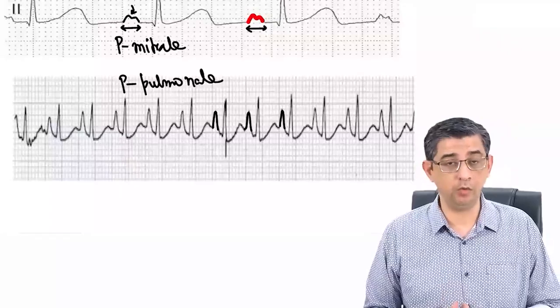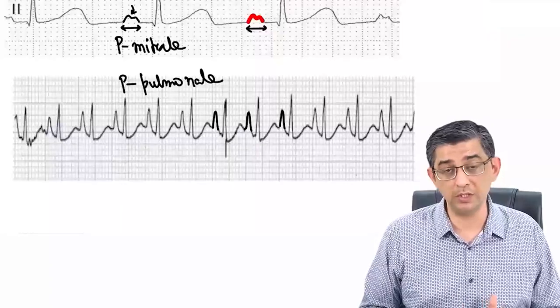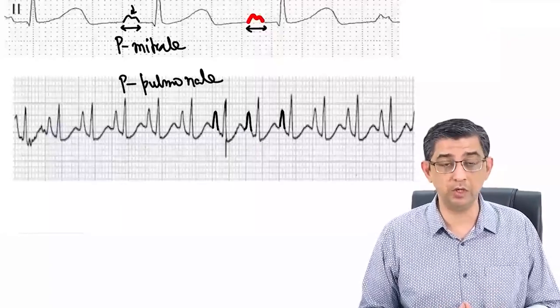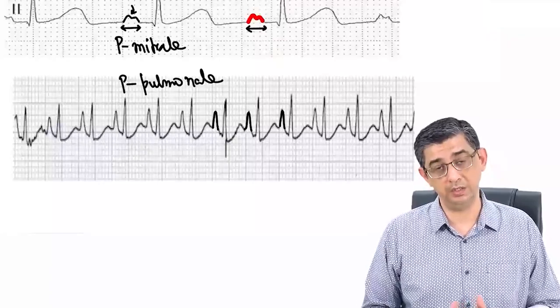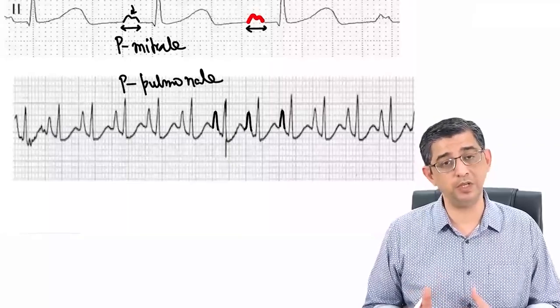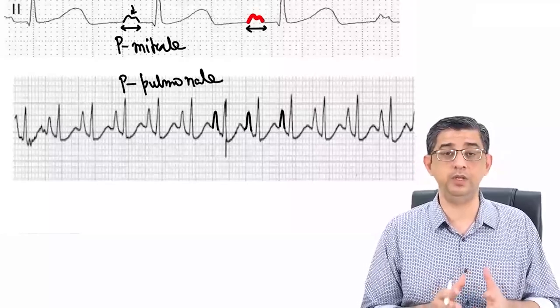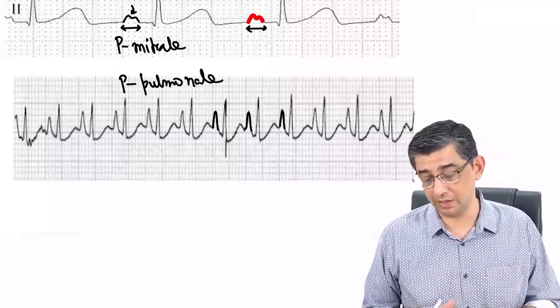And following the P wave, always check whether a QRS complex is present or not, because if it is present, it is normal sinus rhythm. If not, then there could be a possibility of heart blocks occurring in a person. I'll describe the heart block subsequently when I talk about the PR interval, because coming up next is PR. Either PR can be short, therefore there could be tachycardias in a patient. If PR is prolonged, there would be bradyarrhythmias occurring in a person.